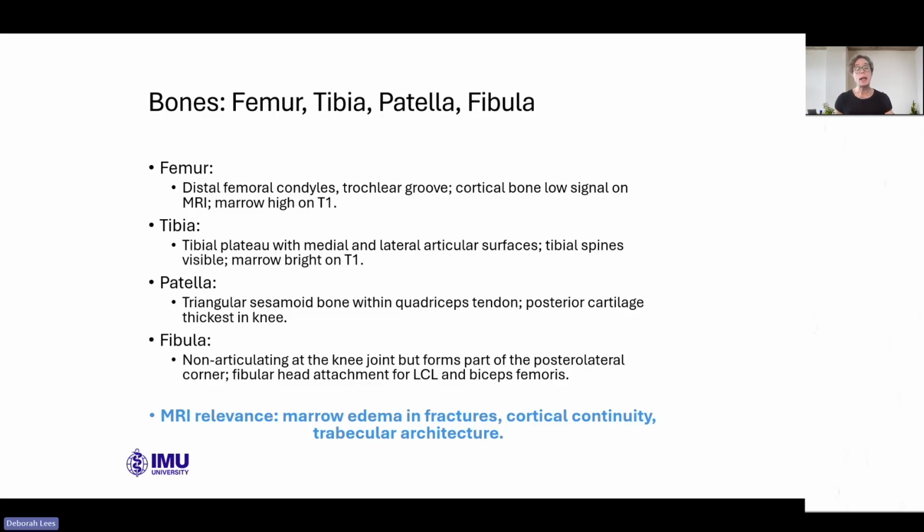So sometimes someone can have an ankle injury and you don't really pay a huge amount of attention because it doesn't look very dramatic at the ankle, but people forget to examine the knee and they miss the injury at the knee. So always make sure you look at the fibular head.